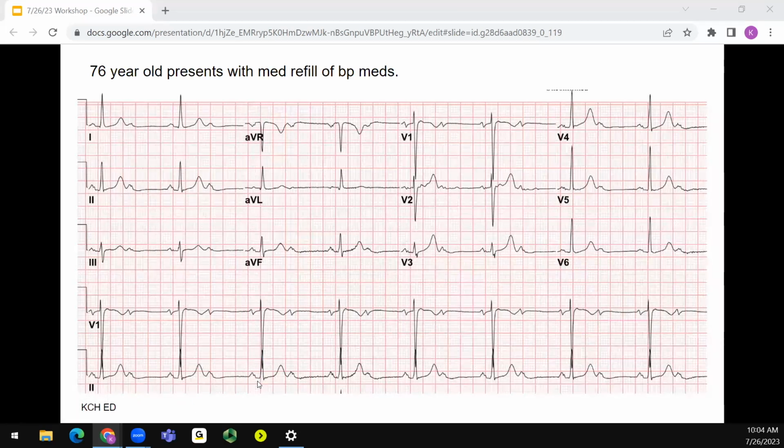When you do have the R wave, you're always going to have the PR, as Silverberg pointed out, and that's going to help you. Right, you'll see P's without QRSs, but you'll never see a QRS without a fixed P in front of it. Exactly. Always type two.